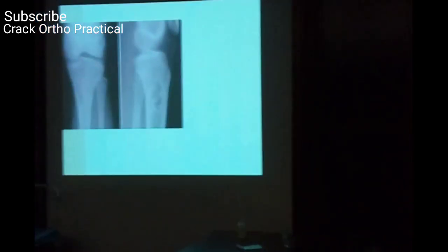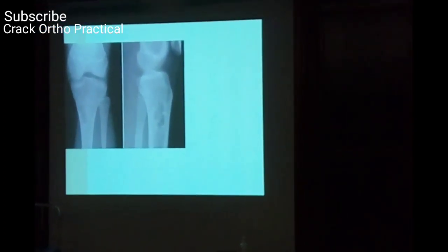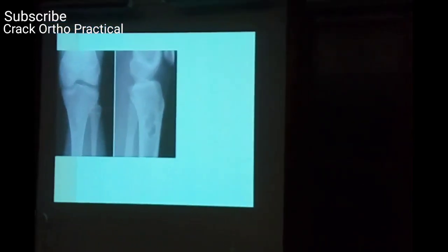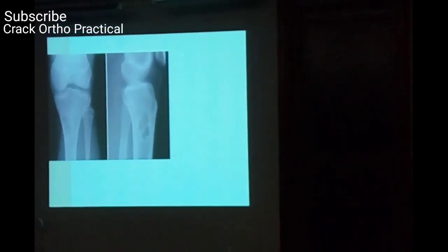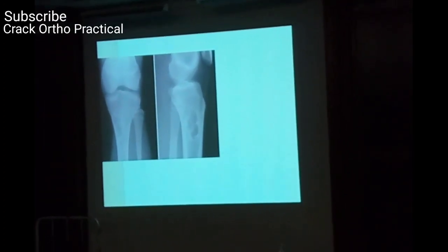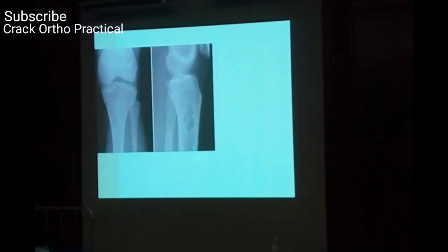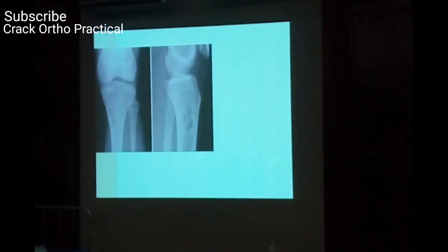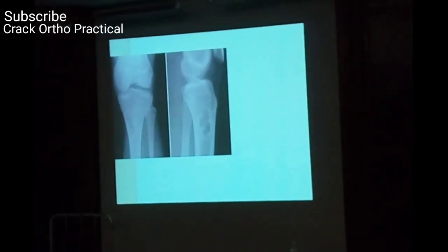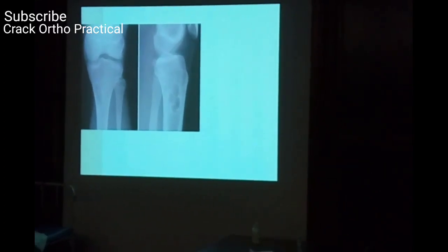The skeletally matured patient. Soft tissue shadow appears to be normal. No periosteal reaction, and clear matrix. Most probably a benign lesion. Differential? I'm not sure about that. Why? Give differentials.